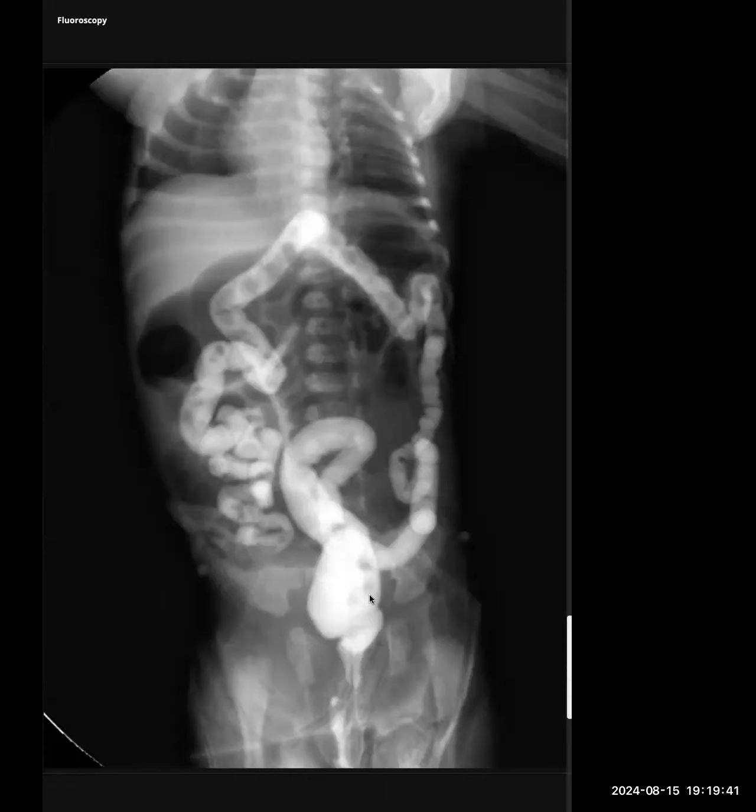So I'll give you a 5.5 here because you got the diagnosis, but you did worry a lot about pneumoperitoneum, which wasn't there. But apart from that, you could have spent a little more time describing that the entire large bowel is smaller in caliber than you would expect it to be. You did describe the filling defects, and this is essentially meconium ileus. You got that right.